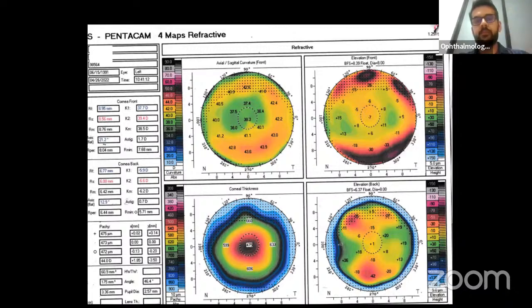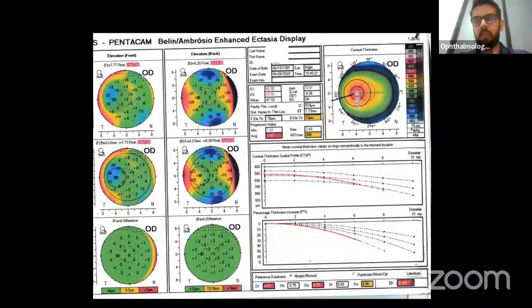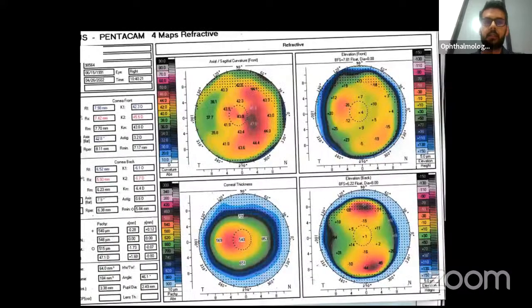Yes, ma'am. Right. So yes, with this, maybe go back to the right eye. That's why Dr. Anil was saying. So now if this is post-refractive, then go back to the right eye. Then in that case, this looks like a decentered myopic Lasik patient. Yeah, with the decentration more towards temporally. Yes. And this is a compensatory steepening of the nasal side. Yeah, not a compensatory steepening. We don't know how the cornea was to begin with, right? Yes, ma'am.